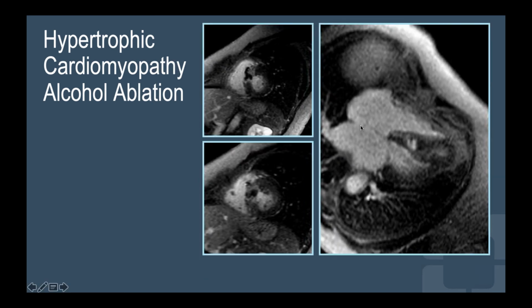And this is what the post-therapy images look like. You can see here on the 4-chamber view, there's late gadolinium enhancement in that basal part of the interventricular septum. Again, this is not the coronary distribution that you would expect in an LAD infarct. This is super selected to that first perforator. And you can see it here on the short axis, and you can see that centrally, it's extremely dark. That's microvascular obstruction. That's complete myocardial death centrally in that area of infarct.